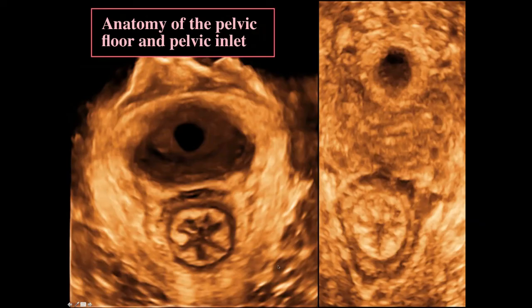So the pelvic inlet, what we call the pelvic inlet, is right here. It's actually a trapezoid type of, or probably ellipse, if you will, type of configuration that contains the urethra, the vagina, and the rectum. And then you can see that the internal sphincter here is echo-poor, and the external sphincter is echogenic. And it's bounded by the levator ani muscles on both sides. And here is a different case where you can see even more detail of the rectum and the vagina.